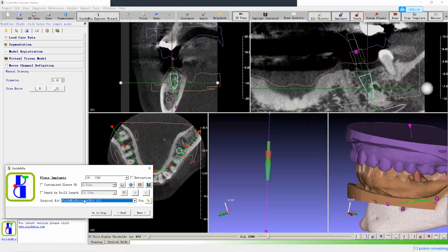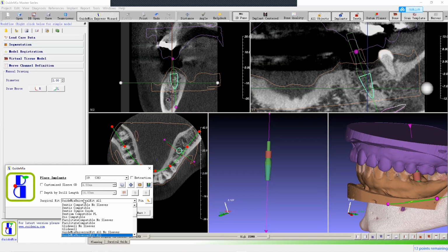So what kit do you use for the guided surgery? Astra. I mean, we place Astra implants, we do some Ankylos, right? But I'll say 95% of our implants are Astra. So do they offer you the guided surgical kit with the longer drills? Yep. Okay. I probably need the information from you so I can put it into the system. Right now we don't have Astra. If you look at here, we have Ankylos, but we don't have the Astra guided kit.